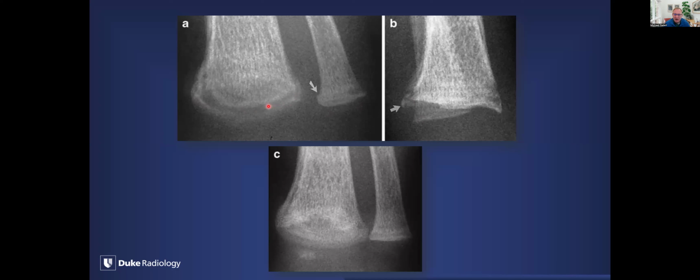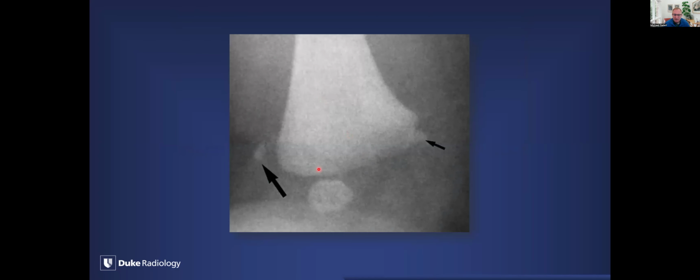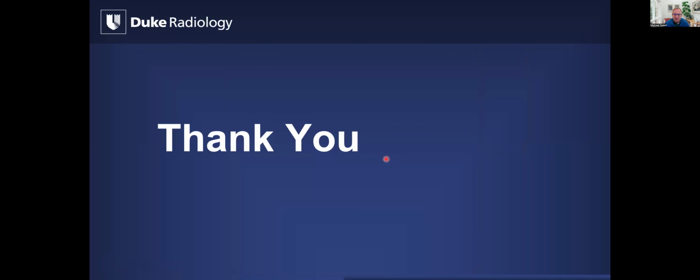These are the same fractures. It just depends on the projection of the image. The corner fracture has this appearance on the lateral view, and the bucket handle fracture on the frontal view. This arrow is pointing to the normal perichondrium, so that's a normal structure. Here are some more examples of classic metaphyseal lesions related to abuse. Here's one. All right, so that's what I have on fractures.